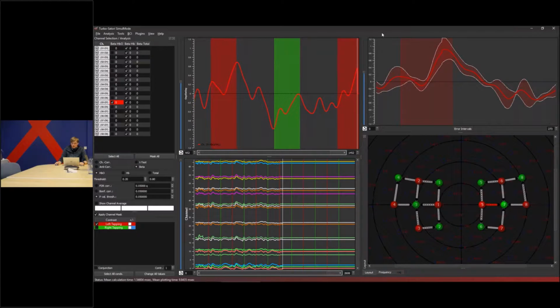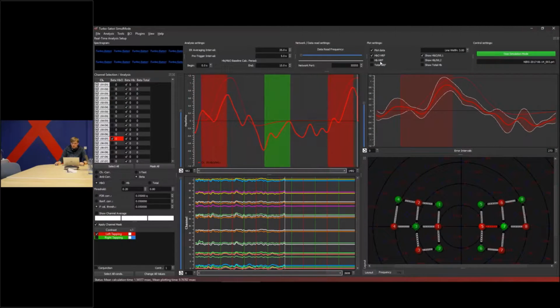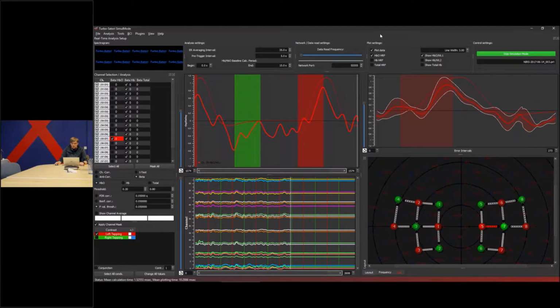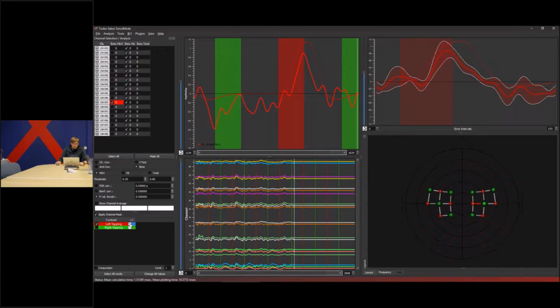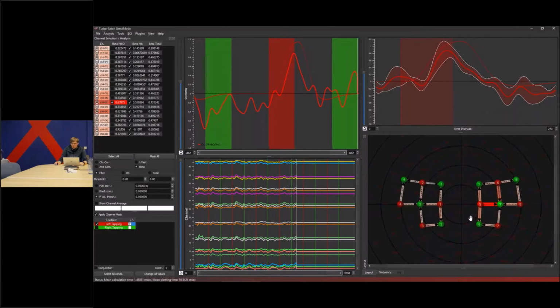So as I said, we use the HRF for the general linear model for the calculation, which is now shown here in the background. And this is our reference function, which we use for the GLM to compare our statistics to. If I want to see how good our statistics are, I can just define now this specific condition, for example, the tapping.